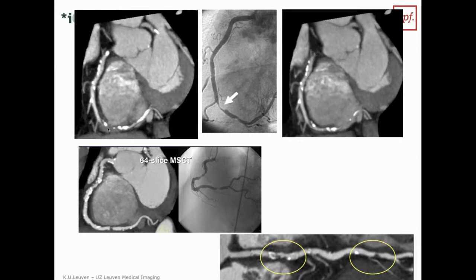One of the interesting things that you can also see with CT is all these white dots here. Now you think about, okay, these are white dots which are highly absorbing. That means that the material can be the contrast agent, it can be metals, or it can be bone. These are the ones which are highly absorbing. You see it's irregular, so it's unlikely that it's a metal structure, because metal would likely be regular. It's also unlikely that it's contrast with this kind of distribution. So the only thing that it can be is still bone in some ways.